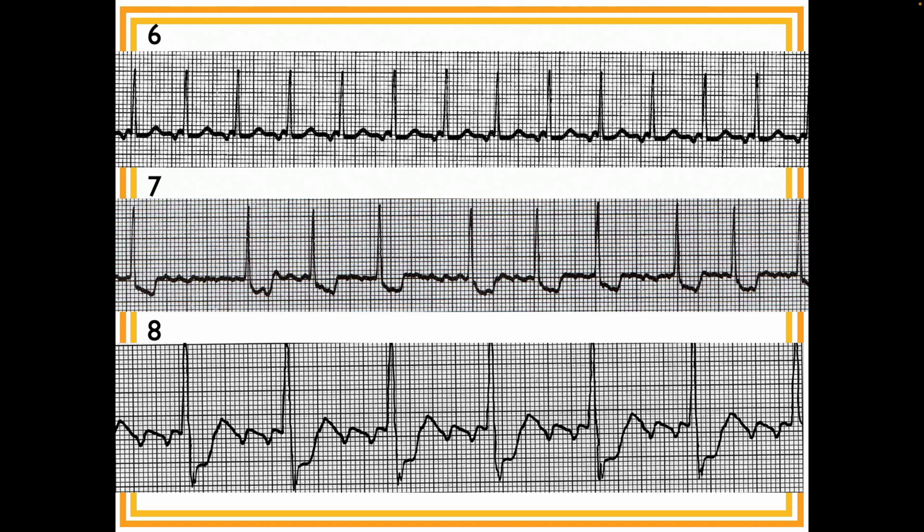Did you say there's ST depression there? Yes, because I would put the J point right about here. So, right here. So actually, the QRS is a little wide, but not terribly wide. Okay, what would the retrograde P waves look like with the T wave as well?